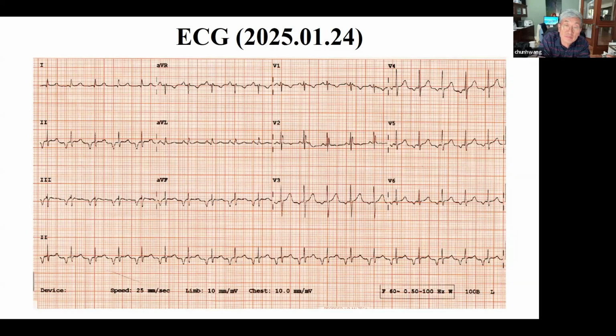Anything else we need to say? Any other differential diagnosis? No? Can you have a nodal ventricular accessory pathway like this? A nodal ventricular accessory pathway, left-sided one? Even though it's possible, usually they are shorter RP tachycardia than this, just a very long RP tachycardia. Okay? So, differential diagnosis. Anything else? Anybody has any other comment?